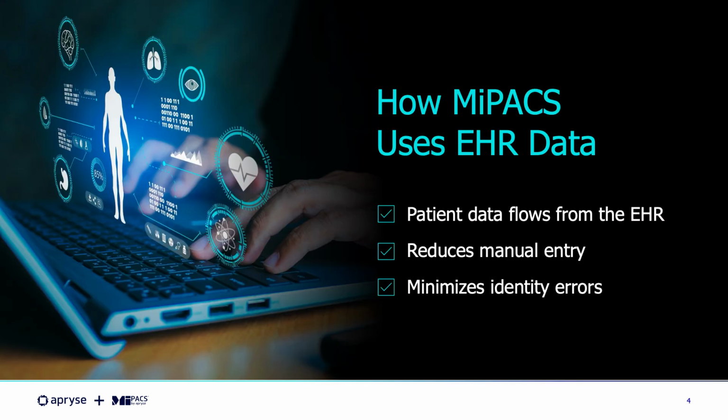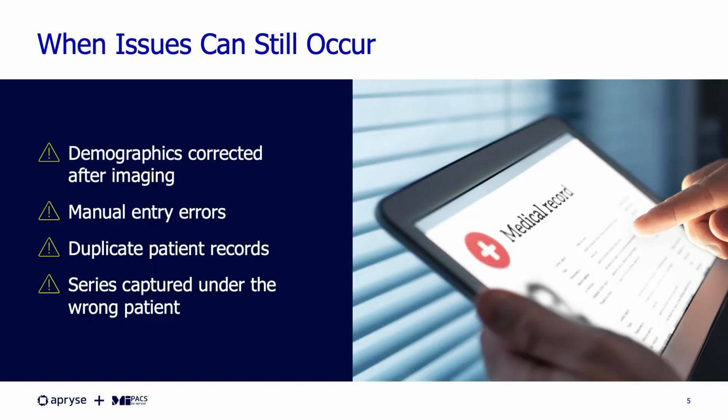When MiPACS is integrated with an electronic health record, patient demographic information is received directly from the EHR. This reduces manual data entry. It also minimizes patient identity errors across systems. In most cases, this process works seamlessly. Even with EHR integration, issues can still occur.